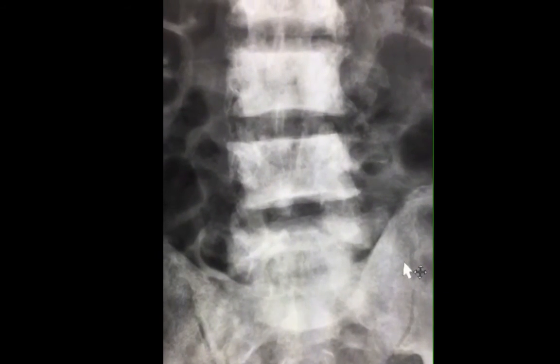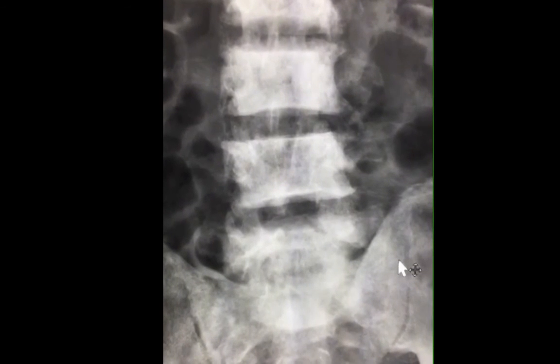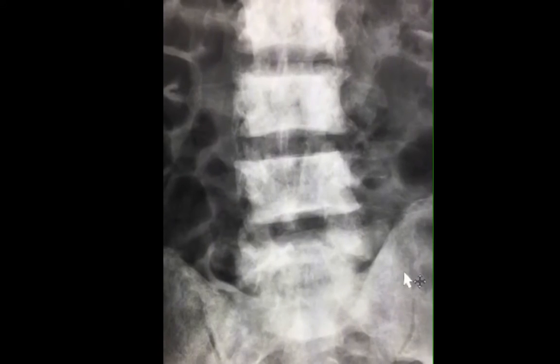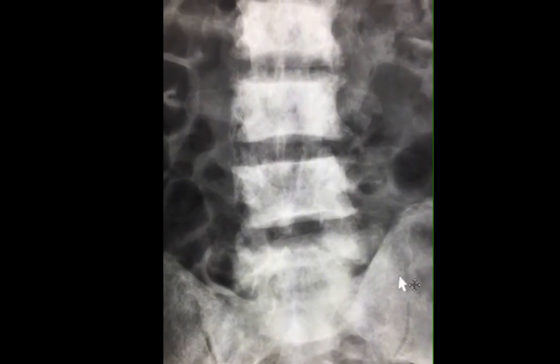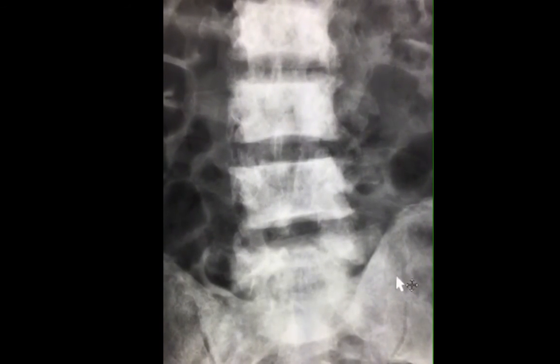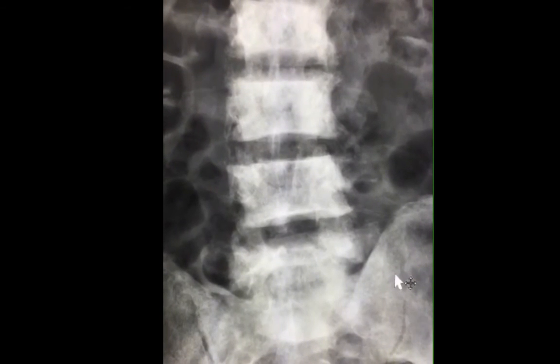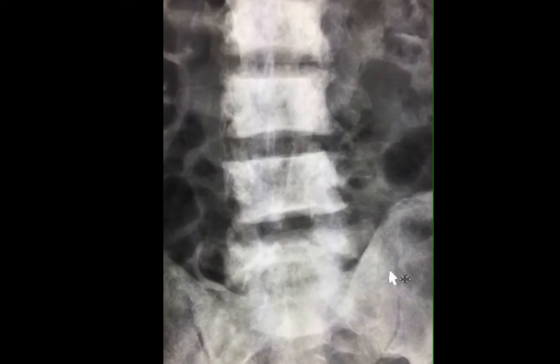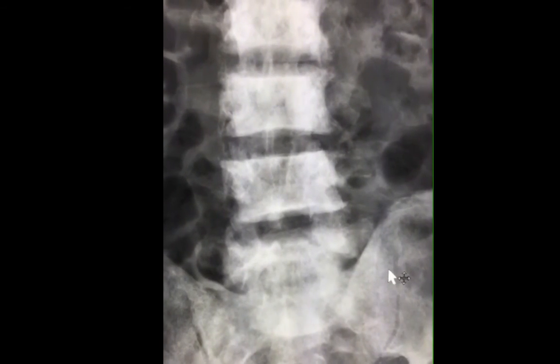And in regions where hemolytic anemias are common, this could be a very common presentation of sickle cell disease. This patient was known to have chronic renal failure, and all the changes that you see within the bones are related to renal osteodystrophy. The first teaching point is never to forget looking at the bones, whether you're looking at an abdominal or chest radiograph.